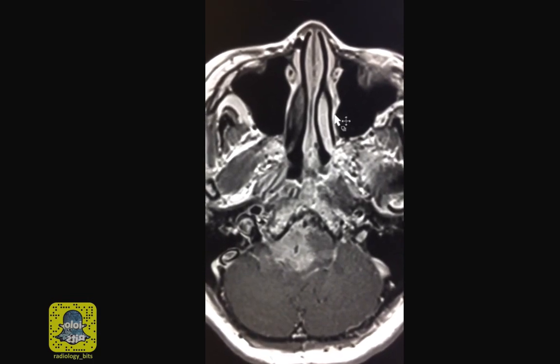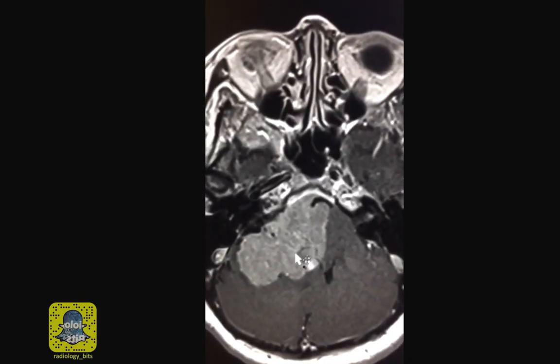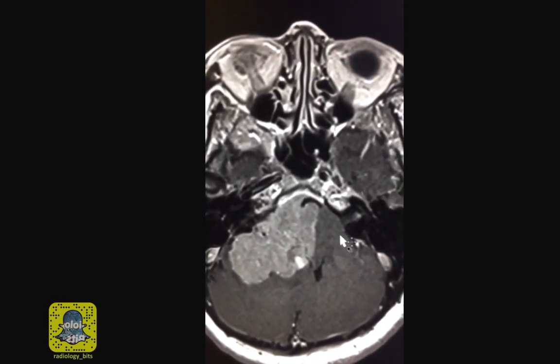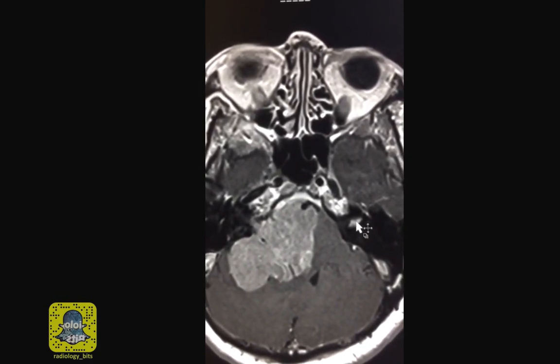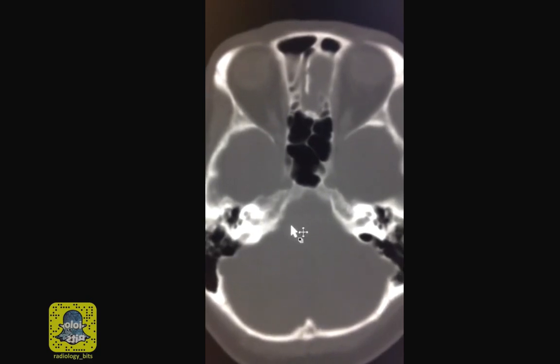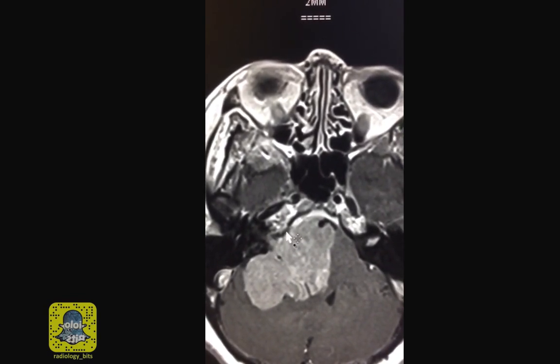Now let's summarize what we talked about today. First, we emphasized the importance to decide if what you're looking at is an intraaxial or an extraaxial lesion. Second, the main differential diagnosis for a right cerebellopontine angle lesion would be schwannoma versus meningioma. You could include others as well. Third, the internal auditory canal should be looked at very carefully. Any abnormal enhancement may mean a schwannoma. Fourth, for calcific changes, whether in the bone or within a lesion, CT is much better than an MRI. Fifth, calcifications, hyperostosis, lack of extension within the canal, dural tail, and a wide dural base would favor a meningioma.